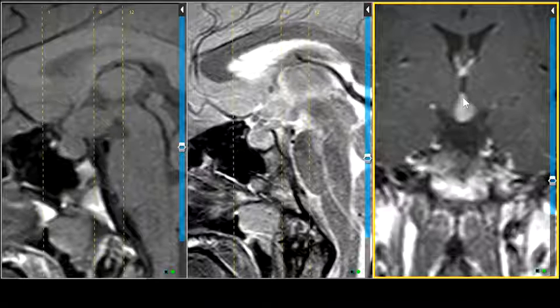You don't see that with hamartoma, and we know that germinomas like to seed the cerebrospinal fluid. Now, even though these are more common in the male gender in the pineal region, in the suprasellar region, some people think a little more common in females. Some textbooks say males equal to females, but there's no major gender predilection. 90% of these present before age 20, and our patient is 14, so fits that criteria. Diabetes insipidus, super common. You can check that box off.